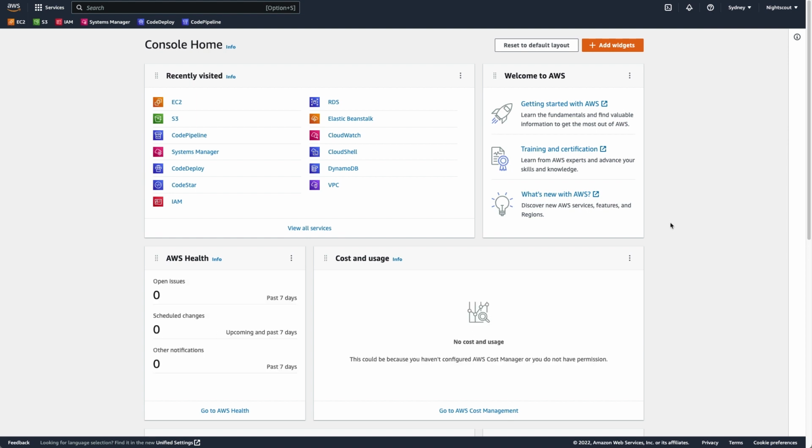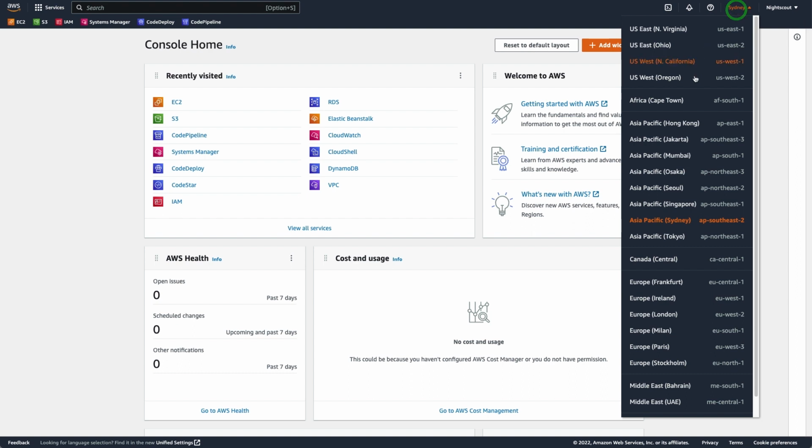I'm in Melbourne, and they haven't got their new data center up and running here. That's coming next year, I think, actually. So I will switch to that one when it becomes available. But you do need to take note of which one is close to you.